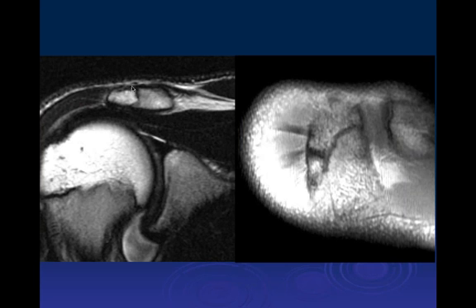Just remember, in teenagers, this area where the os develops, what's the word I'm trying to find here, John? Physis. Yeah, thank you. The physis here may not close until age 21. So seeing a physis in this location, especially if you see no fluid in it, up until age 21 can be very much normal development. Actually, it can go up to the age of 25 in some cases. Okay, thank you, John. Age 25.